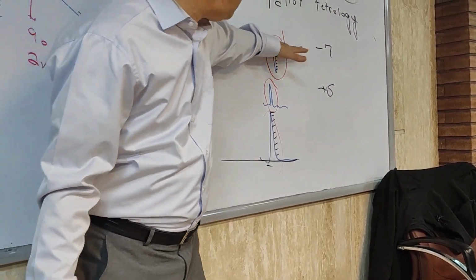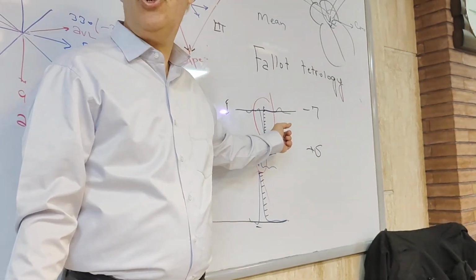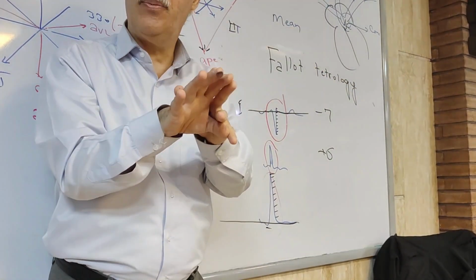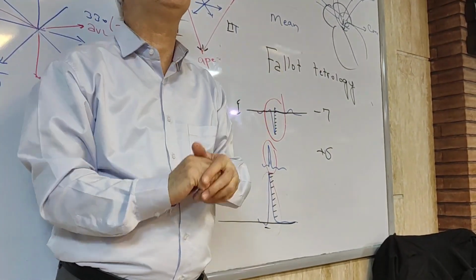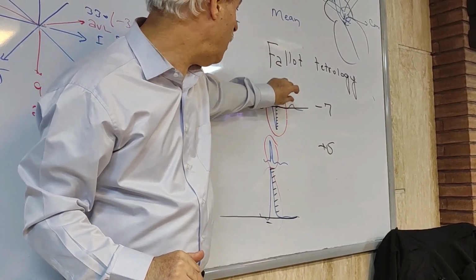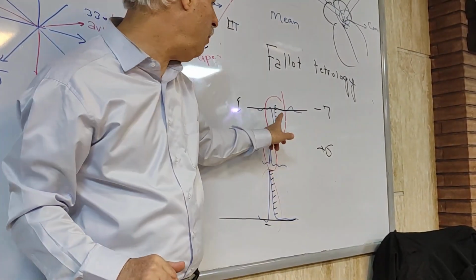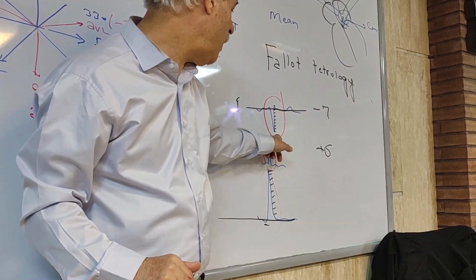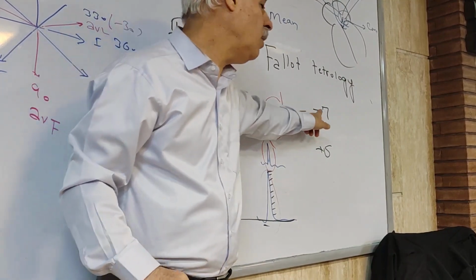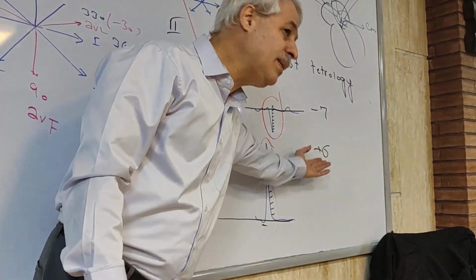I make a straight line where there are no voltage changes, where all the ventricles are depolarized, meaning the ST segment. A perpendicular line. Above the line is positive, below the line is negative. Count them down. 1, 2, 3, 4, 5, 6, 7, 8, minus 8, plus 1, minus 7. From limb lead 3, plus 8.